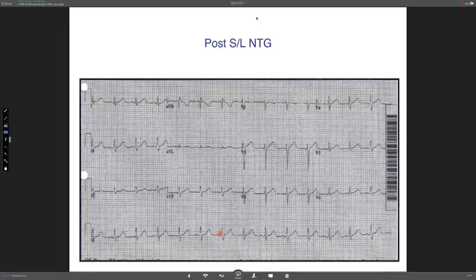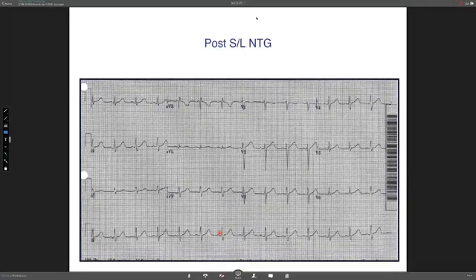Fathi, just before you go to the last question, I agree. A short PR interval, if you think about it physiologically, is the distance from the sinus node firing all the way to activating the ventricle through the AV node. So if you have a slick AV node, you see it very commonly in young patients, and I think your patient was young, Fathi, is that correct? Yes, 37. So in young patients, we call it a slick or enhanced AV node. It's very common, we see it a lot. And as long as there is no evidence of delta wave or pre-excitation of the ventricular signal, a short PR interval is a normal finding in a young patient.